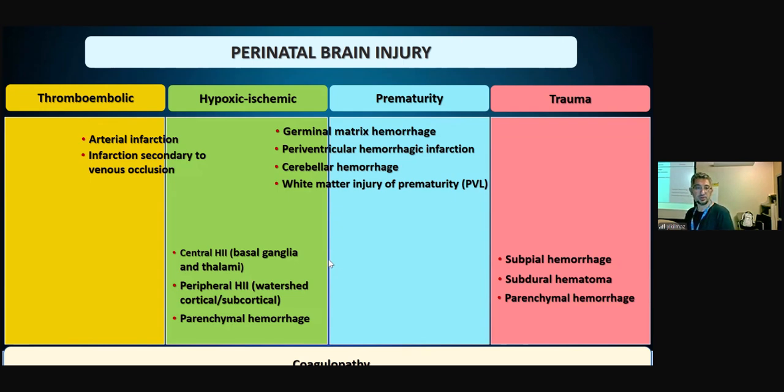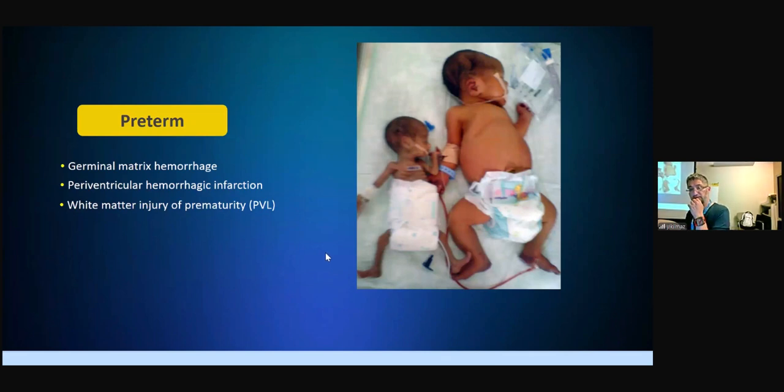Before I start, we need to learn that there's a saying in pediatrics that children are not small adults. And in neonatology, there is a saying that preterm neonates are not just small neonates. Because their anatomy is different, their physiology is different, the diseases we see in them are different. So this is a preterm, this is a term baby. As you can see, they are not the same.